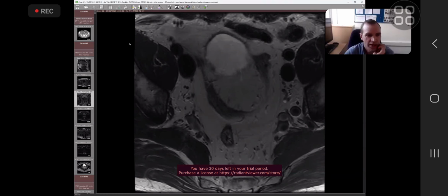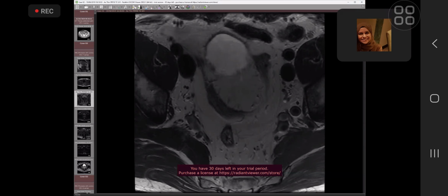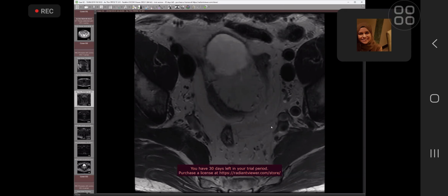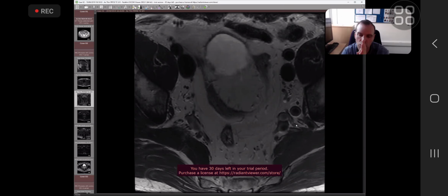So I'm just going to get you on to the case here. The case was a 62-year-old man with a PSA of 4.85, and you've got the prostate MRI. If you request control, then I can give you control of the mouse. Yes, requested. Let me give you that. So talk me through. Do you have much experience in prostate MRI? No. Okay. How do you think you would approach looking at the prostate MRI?